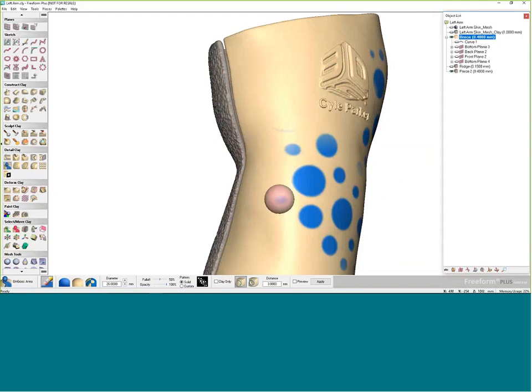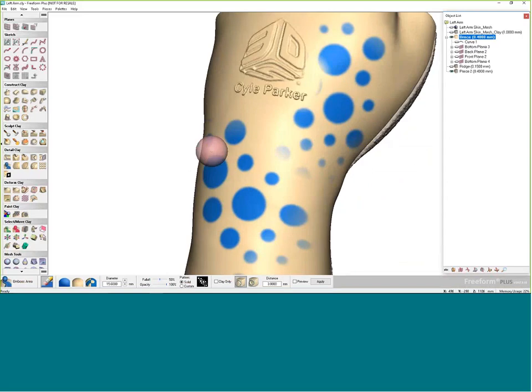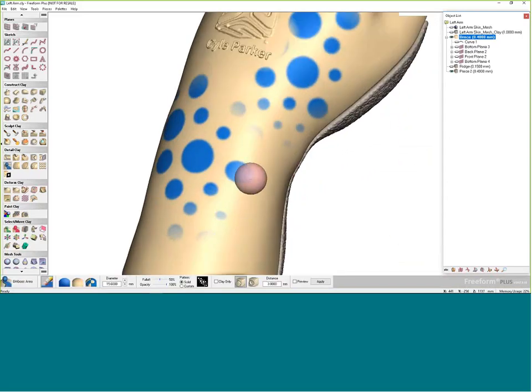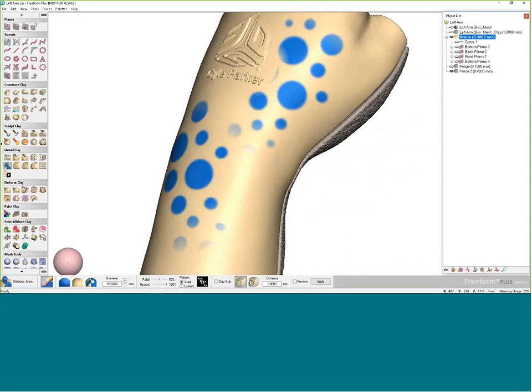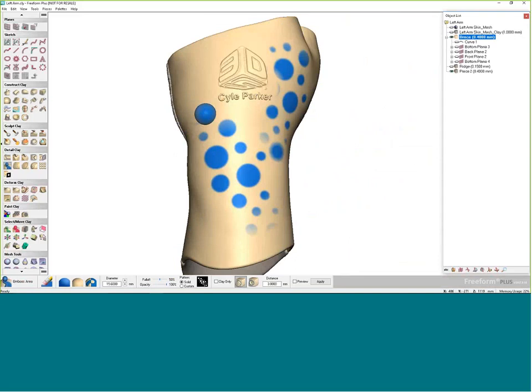I'll go ahead and remove that one. I'll keep a couple more of these. This one's pretty stretched. This one's really stretched. And one more. Then we'll go ahead and just add a couple of these back in using my little tool here. That looks pretty good. Actually, I'll Control-Z that, and I'll put it right over the top of that one.